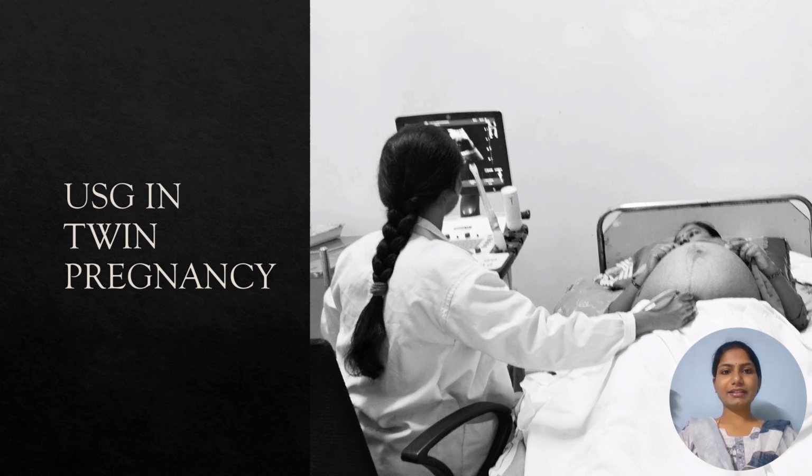Hello everyone. Yet again, I am back with a new video, and the topic of discussion for today is ultrasound in twin pregnancy. So, as obstetricians, we must be very clear about what scan should be done when, especially when it comes to a dichorionic or a monochorionic pregnancy, the importance and the things which you have to look for in further serial surveillance. So, why delay? Let's move on to today's agenda.